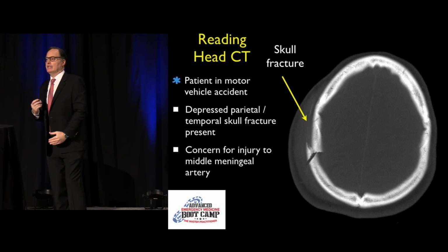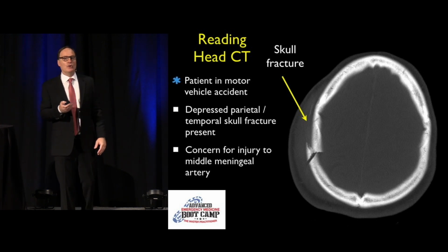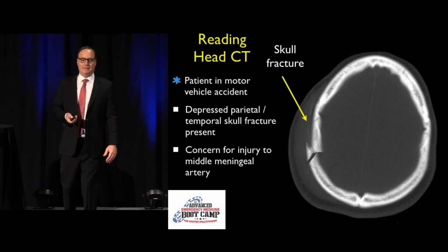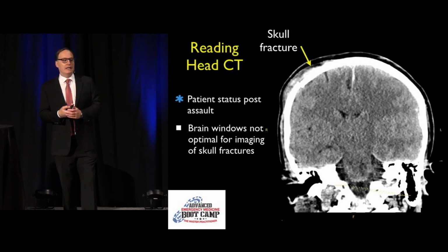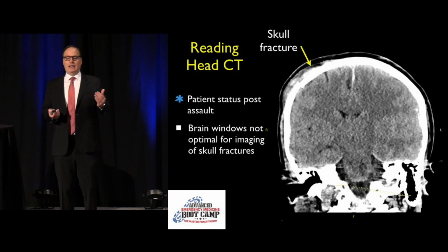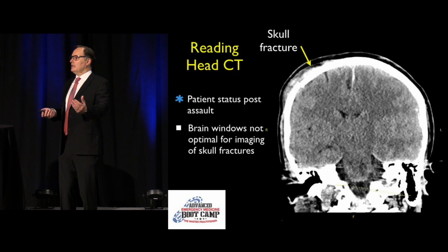And in fact, this patient did go to the operating room and got surgery. Okay, you don't want to have that thing kind of poking around in your brain as you're going around your business. Okay. Here I thought this was an interesting one. This is a patient who came in, got hit to the head, assaulted. And if you look on this image, I think I see a skull fracture. I'm pretty sure there's a skull fracture.